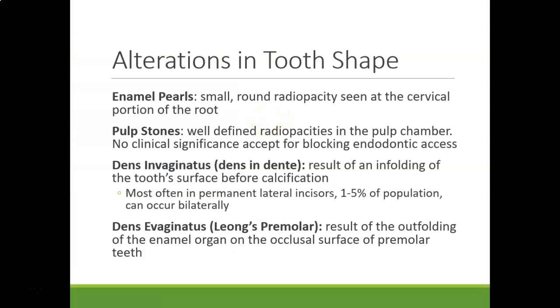Here is a bifurcated root on this canine, I think is what we're looking at, right up through there. It's kind of hard to see. That one was tricky. At first I was like, what are we looking at here? But it looks like it's bifurcated right up there at the apex. Some other, oh, you know what, this could also have another abnormality too. This could be from this next slide.